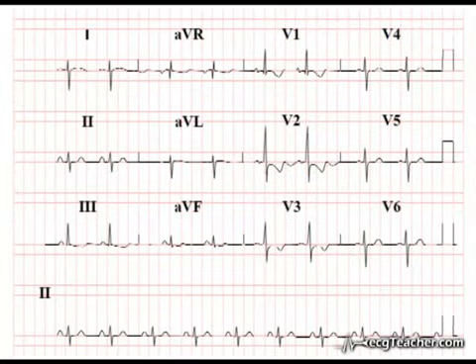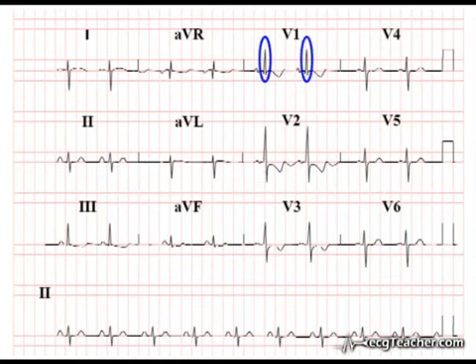To complete our brief discussion of the ECG changes associated with RVH, it is worth mentioning that although there are other causes of a dominant R wave in lead V1 unrelated to hypertrophy, the V1 R wave voltage criteria we've just applied to this ECG have reasonable specificity.